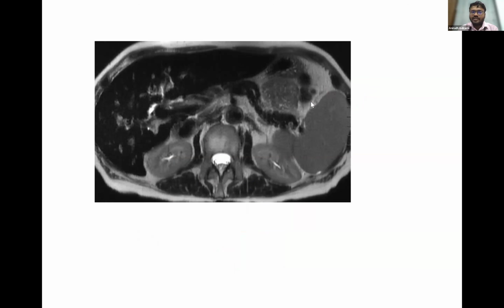In this you are seeing that the liver is pitch dark in T2, but the spleen is not dark. So this is a case of primary hemochromatosis. In primary hemochromatosis, there is an iron overload due to increased absorption of iron through the GI tract. Excess iron is deposited in the hepatocytes, pancreas, myocardium, skin and joints, but not in the spleen.